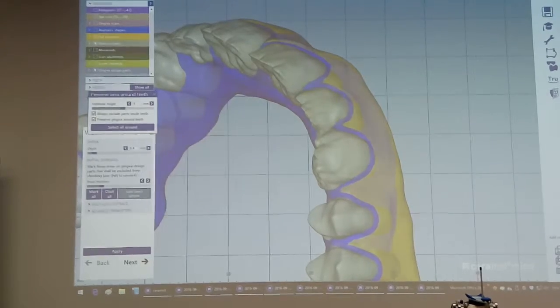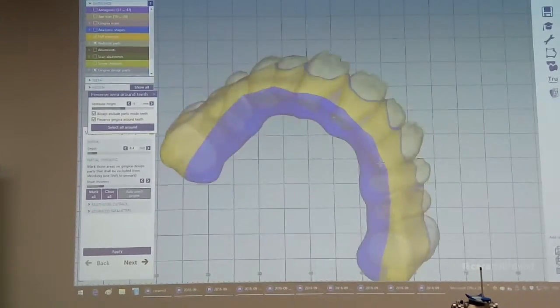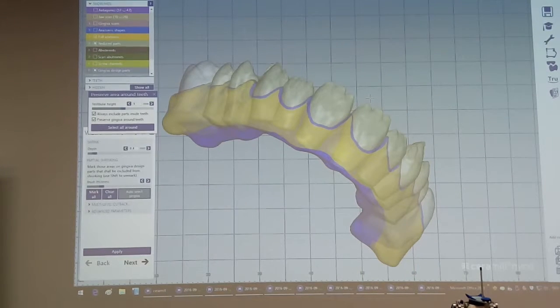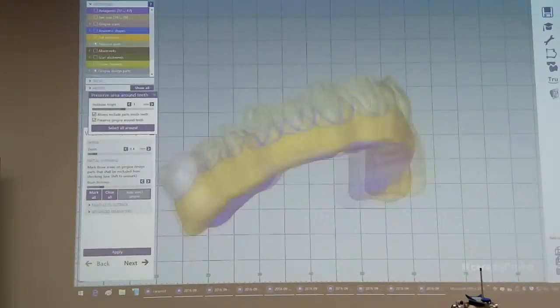Never in my life I would like to follow here with a monolithic structure in the front. This looks not good. That's why we are reducing more or less the labial side, but from the palatinum side we can stay with the surface. This is always the decision of technicians.